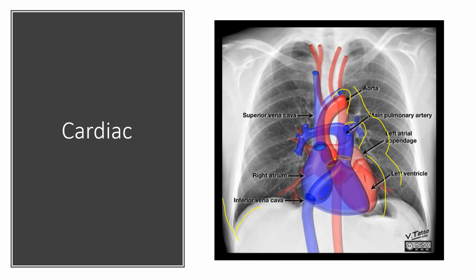So when you're looking at this, you want to see also the cardiothoracic ratio, how much size the heart's taking up compared to the thoracic cage. Now in this x-ray, this is a normal ratio, right? So this is a PA x-ray, and AP, it's going to look closer to 50%.